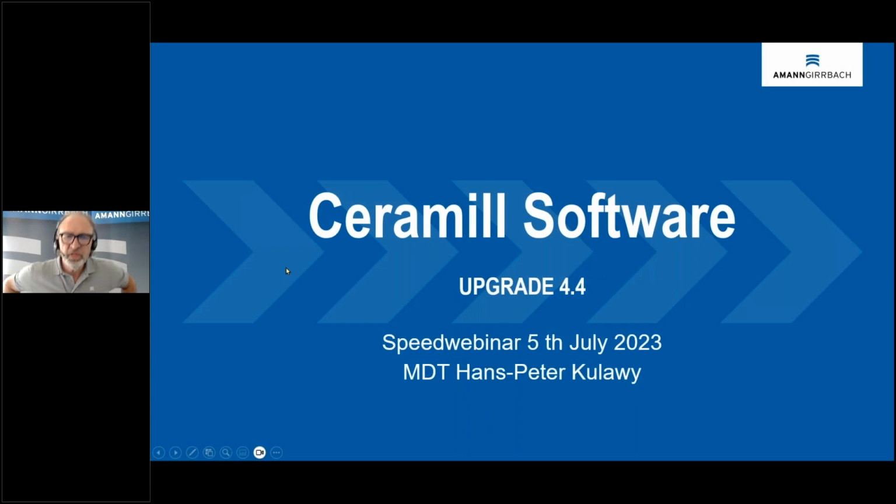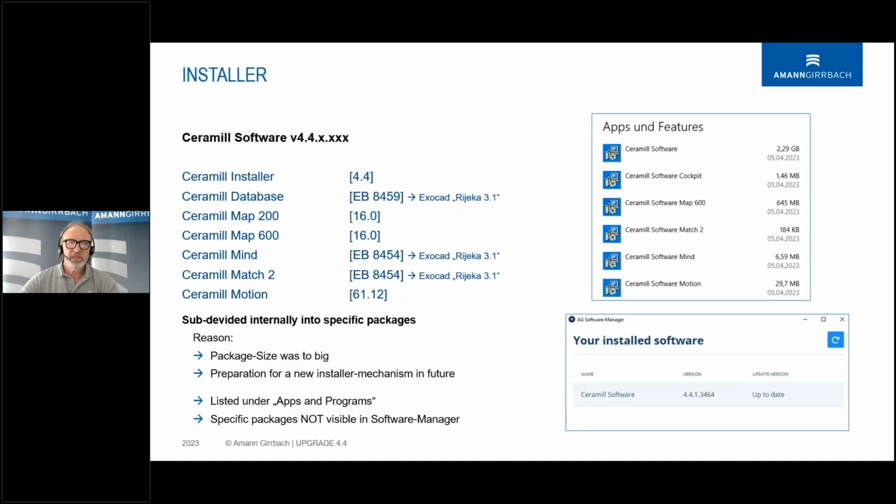Okay, the issue for today is the Ceramill software upgrade 4.4, it's called. Speed webinar from me. And we will start with the software itself. It changed. The last time we offered the 4.3, and within the 4.3, we installed an additional software on your PC, and this software is called AG Software Manager.